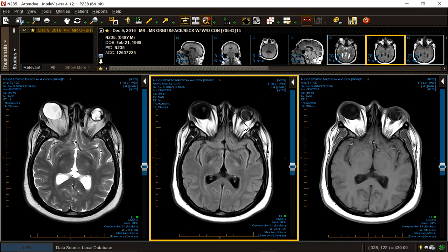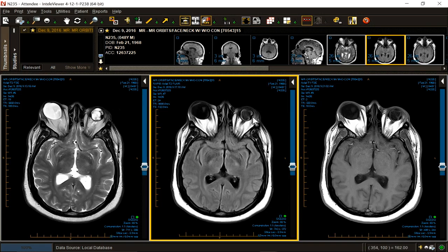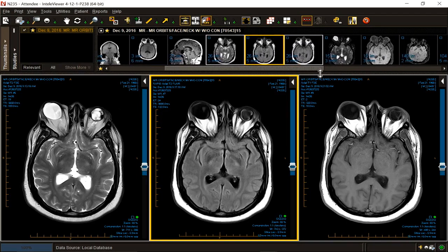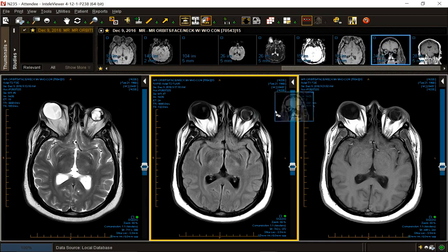So in the left eye, there is globe contraction. There is slight enophthalmos. There are areas of septated fibrosis and blood. We would visually and clinically refer to this as phthisis bulbi. Let's continue on down to a coronal.